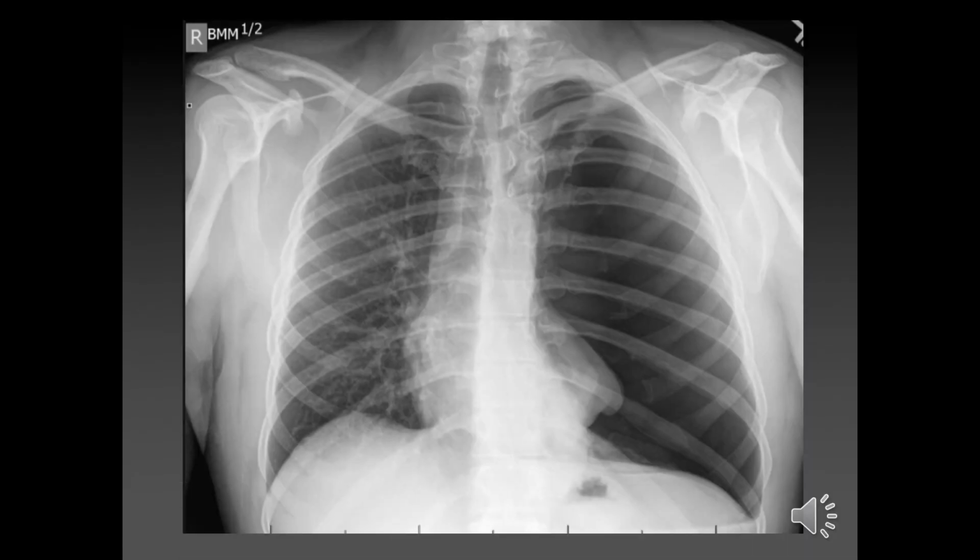So this is a deviated trachea. Spot diagnosis, anybody? Do we have any 50 years here? It's just one, isn't it? Sorry, yeah. So you should know this. Yeah, so that's a tension pneumothorax. Tension pneumothorax is when there's loads of pressure where the air is going into.